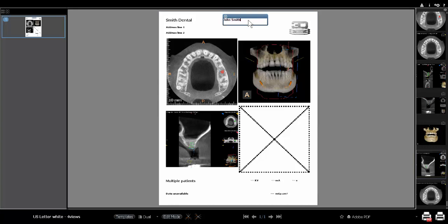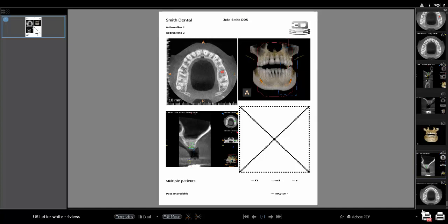To print your composition, choose either to print to a printer or print to a PDF. There are also multiple frame display options available when hovering your mouse pointer over an image. Hovering your mouse pointer on an image brings up the options bar from which you may change the zoom control of the image, comments to be added to the image, which annotations or overlays are shown on the image.